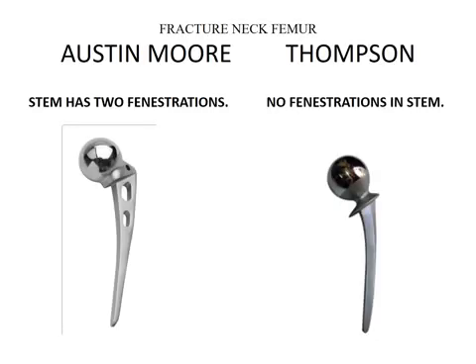Then we come to the prosthesis. Prosthesis means replacing the body part. Till now we were doing surgeries which are fixing it. They were fixation. We talk about prosthesis. The classical prosthesis, that is hemiarthroplasty, means replacing half the joint, is called as Austin Moore or Thompson prosthesis.